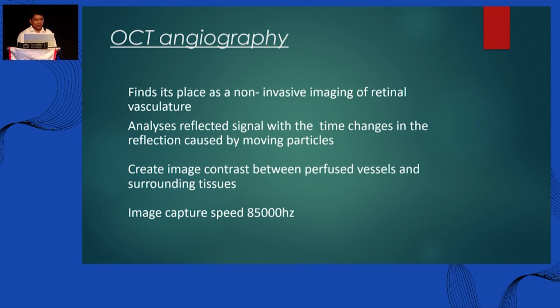Because OCT is practically easy to do in a clinic setup, the basic advantage is that it is non-invasive. You don't need a fluorescent material or a contrast material to help see. It is just a basic OCT with moving red cells. The only moving particles on the retina are the red cells, so you are just looking at the red cells.